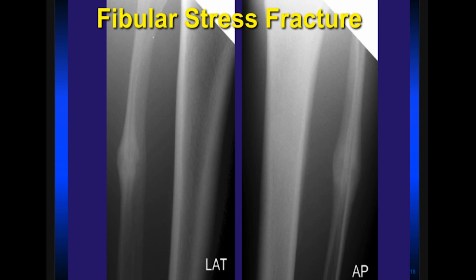This is an example of a fibular stress fracture in a basketball athlete. You can see the big wad of callus in the fibula. The fibula is a very interesting bone, and it seems mostly cortical with very little cancellous bone, and perhaps this is loaded abnormally because the fibula anatomically was longer, or oftentimes these fibular stress fractures happen in a jumping sport like a gymnast or basketball.